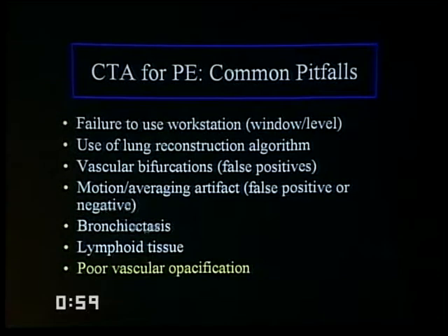Poor vascular opacification. Timing is sometimes an issue. In patients with cardiomyopathy, slow circulating blood volume, one sees the contrast is still on the right side of the heart. Very little has got through to the left atrium, and we have a non-opacified vessel here. Well, one always should follow a completely non-opacified vessel to the heart, and this is in fact a pulmonary vein which is not opacified. The contrast is still in the pulmonary arteries.